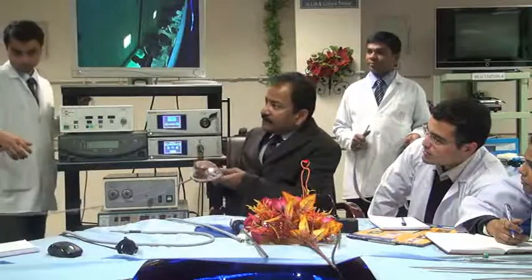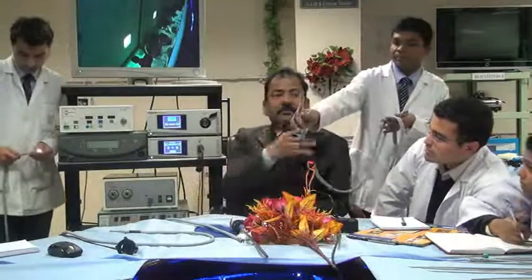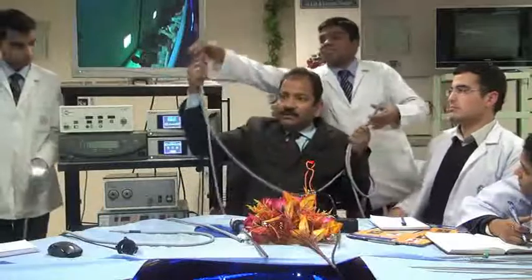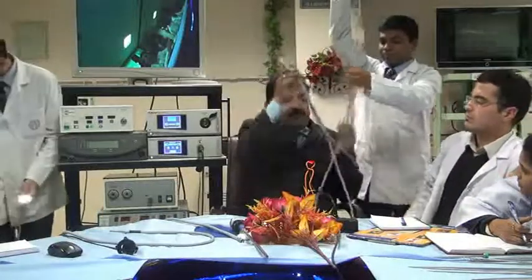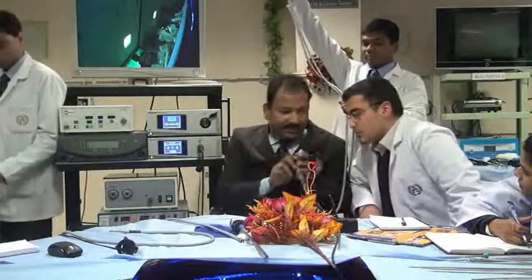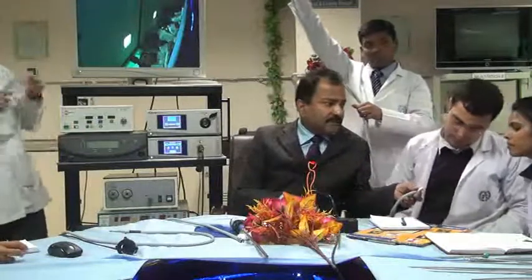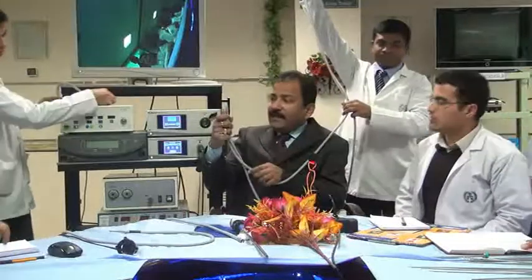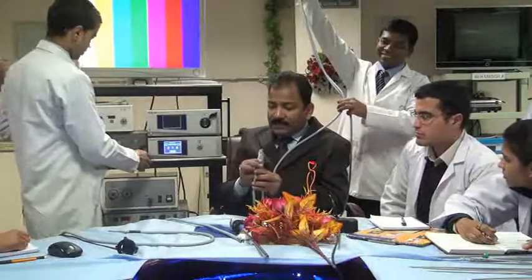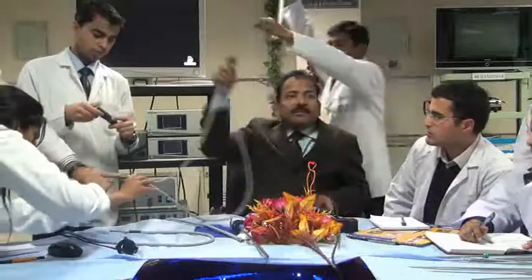We have to test it also. Yes, black spots are important to recognize. When you have two light cables like that and I don't know which one is good, I keep one end to one side and look from the other end like that. See here, there are black spots, and here there is no black spot or fewer. So this bad one looks good from outside, but actually it is bad. These are the broken fibers, and those broken fibers you must avoid.